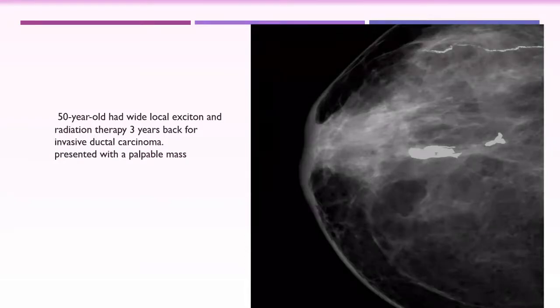Dystrophic. Yes. Type. Okay. The palpable abnormality in this patient is exactly this dystrophic calcification. What is the clinical significance of this? For the next follow-up, the patient is now presenting with this. How could it help us if the patient developed any recurrence?